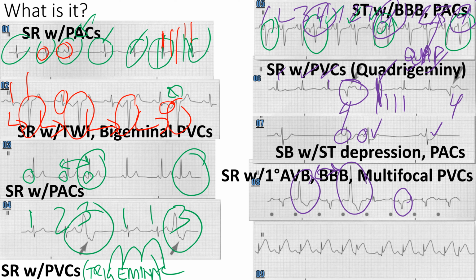Also, those first degree AV block, we didn't mention that. Just look how big that is, bigger than a big box, right? Here definitely has some ST elevation, right? The ST, that's supposed to be a straight line. So you can see the ST elevation is there, all the way across.